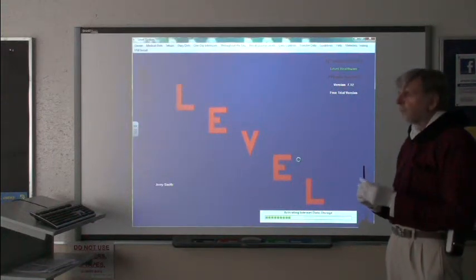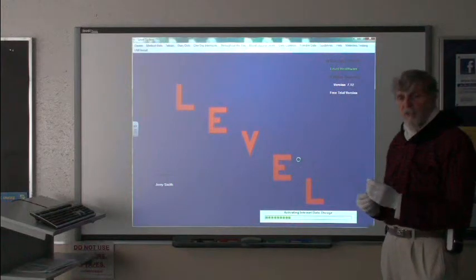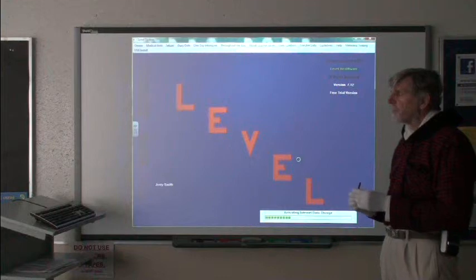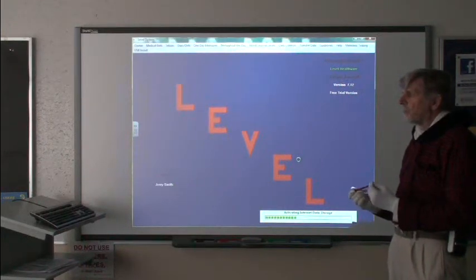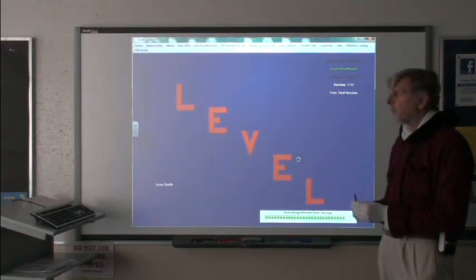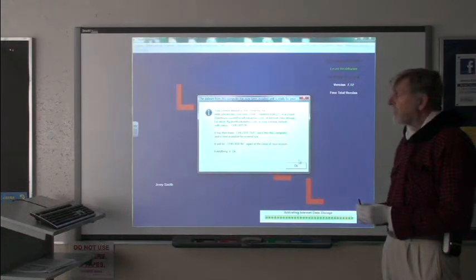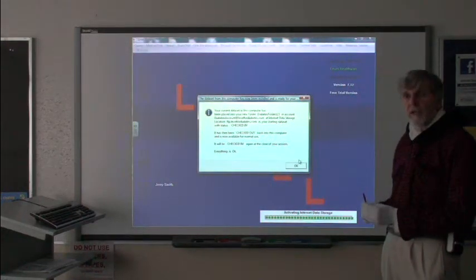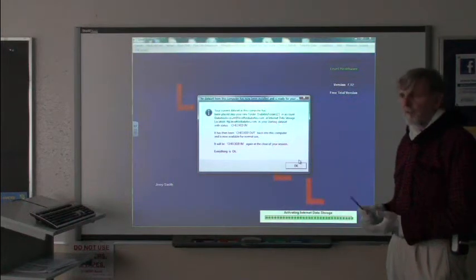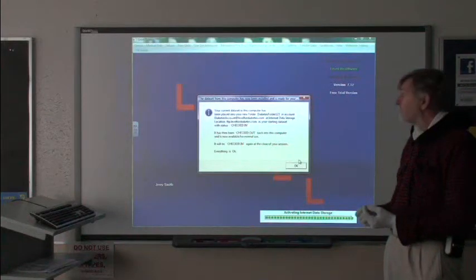I would like to point out that the third scenario in which you might detach from one web location and attach to another web location is when you have finished using the company websites for the first few weeks of your learning process and you want to switch on to the one that you acquired for yourself. In that case, you would go through a scenario exactly as we've gone through here. It's extremely easy to do. You just detach from the company website and then you attach to the new one that you've acquired.